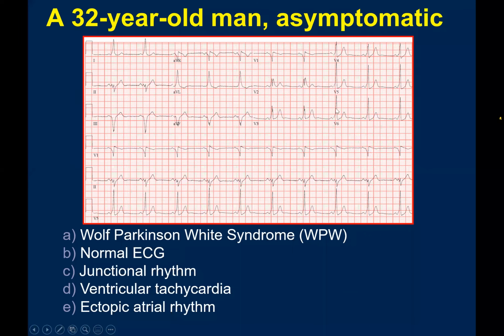So then you are making the diagnosis of Wolff-Parkinson-White syndrome, which is an accessory pathway that can conduct between atrium and ventricle. In this case, we call it antegrade conduction. It's conducting from atrium to ventricle. If only retrograde conduction, then the 12-lead ECG would be normal. The only way to know is when you are in the EP lab and you pace the ventricle and you see conduction retrogradely through a pathway, not from the AV node.